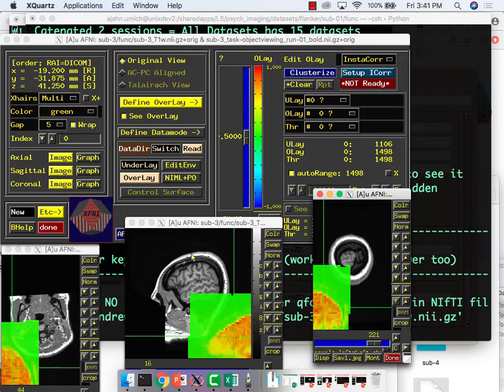Because it is relatively quick, we should be able to change it if we need to. There are a couple other options. The best one I found is something called init xform auto align. It does the align centers script, and if I've ever had a problem with that, that always fixes it. I haven't had a case where it's failed.